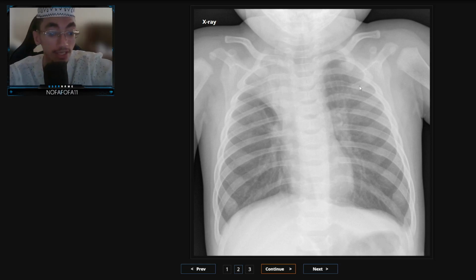Meanwhile, on the left side, it's normal. The left side for the lung fields, they're all normal. This is a pulmonary blood vessel, all right? From the hilum and it spreads out. That's normal. So let's again summarize the abnormal finding.